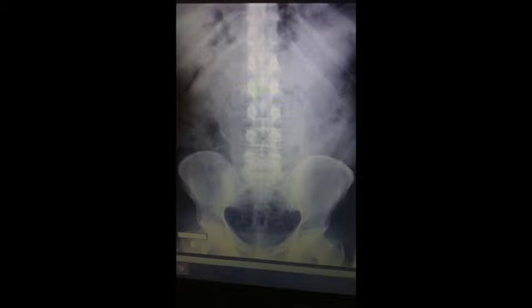This is the evaluation criteria of the 9 images that I took for my barium enema contrast study for the large colon. The first is a KUB, which shows the state that the colon is in. We need to have proper collimation. We need to be able to see the area from the pubic symphysis to the upper abdomen. 2 images might be necessary if it's a larger person.